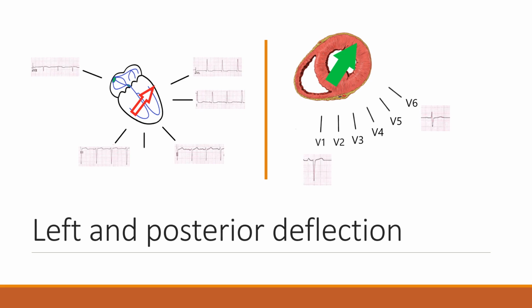If I have my little cheat sheet, it's going to say, well, if the QRS is down in lead 2 and it's down in lead 3 and up in AVL, you have left axis. Well, guess what? If the QRS complex is the most positive in lead AVL compared to any of the other hexaxial leads, you have a left axis. And it's going to be down in 2, it's going to be down in 3. That's redundant and already known. You don't need to do that.